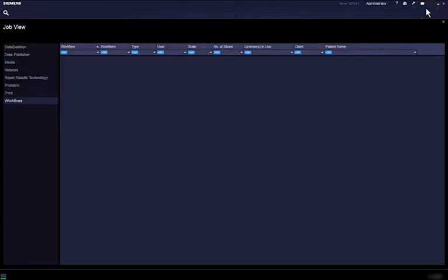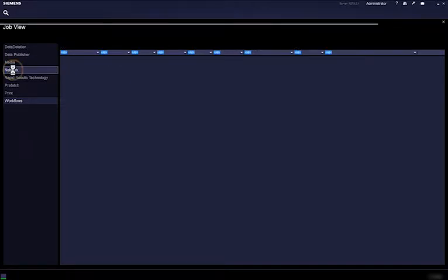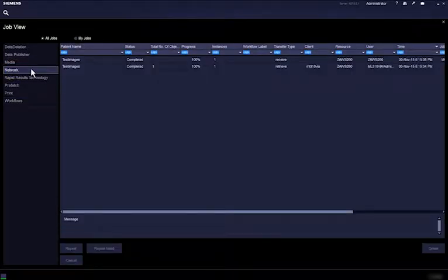Navigate to the suitcase icon on the upper right corner of Syngo VIA and select Network to check the current network's tasks. You can filter your own self-initiated tasks.